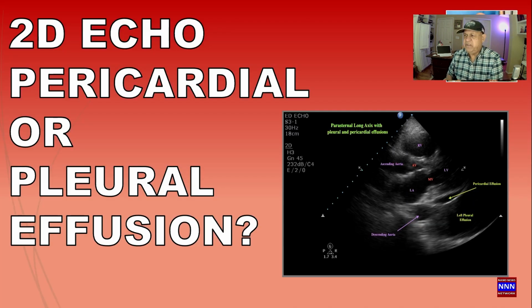So ladies and gentlemen, this is a quick overview of how to differentiate between pleural effusion and pericardial effusion, both right and left pleural effusions from pericardial effusion.